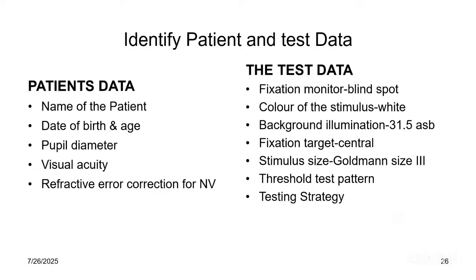point. And it is important because that point actually corresponds to the blind spot, and it's also occasionally tested by the machine by presenting a light stimulus at that point to see if the patient will perceive it. If the patient is able to perceive light at that point, it means that the patient is not fixating, because the patient is not supposed to perceive it.